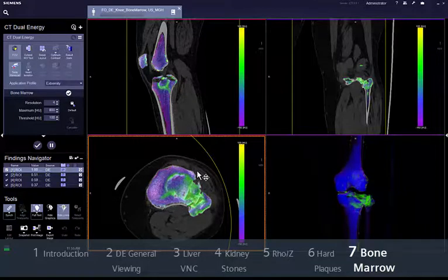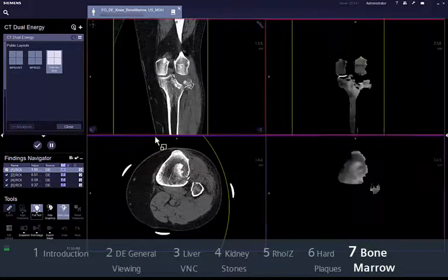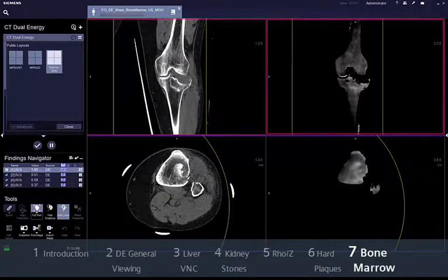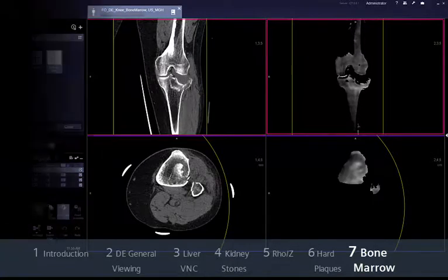Therefore, higher densities shown in green or yellow on this image could indicate various pathologies, such as bone bruises after trauma and diffuse tumor infiltrations. A side-by-side layout or a quantitative analysis can help you in the evaluation of such cases.